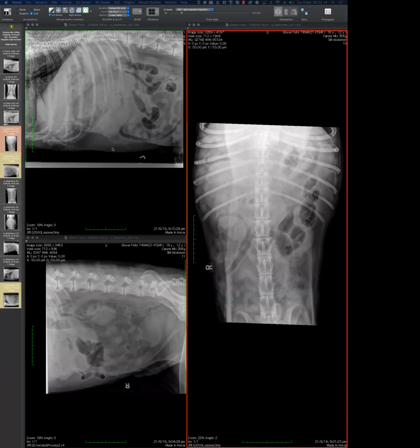Okay, so you're not really buying the option. Because I could argue back and say, for the idea of that being displaced colon, there are a couple of things that really fit. First, those things are displaced to the left, and the mass is on the right.